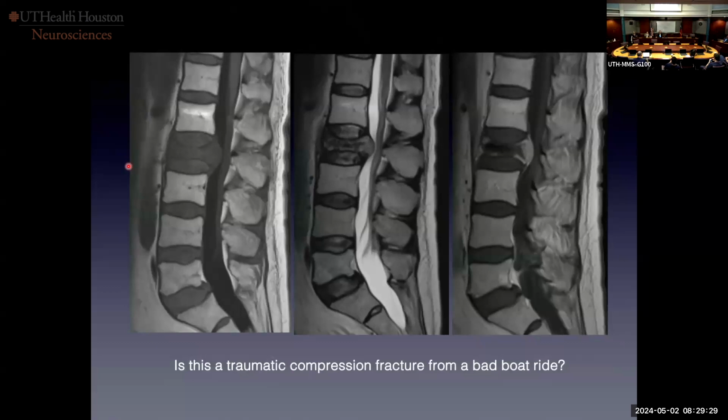But I'm not going to suggest that this is always easy. When you have an acute compression fracture with a lot of bone marrow edema, this can be difficult. But the posterior bowing of the cortex is a very concerning finding, very concerning finding. Lack of any preserved normal marrow, that is a concerning finding as well.